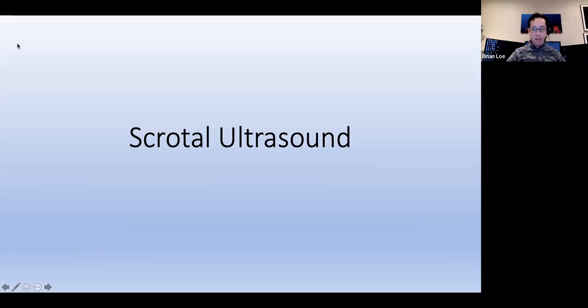So today I'm going to give you a lecture on scrotal ultrasound. We'll talk about the anatomy and some of the pathology that you may see with scrotal scanning.